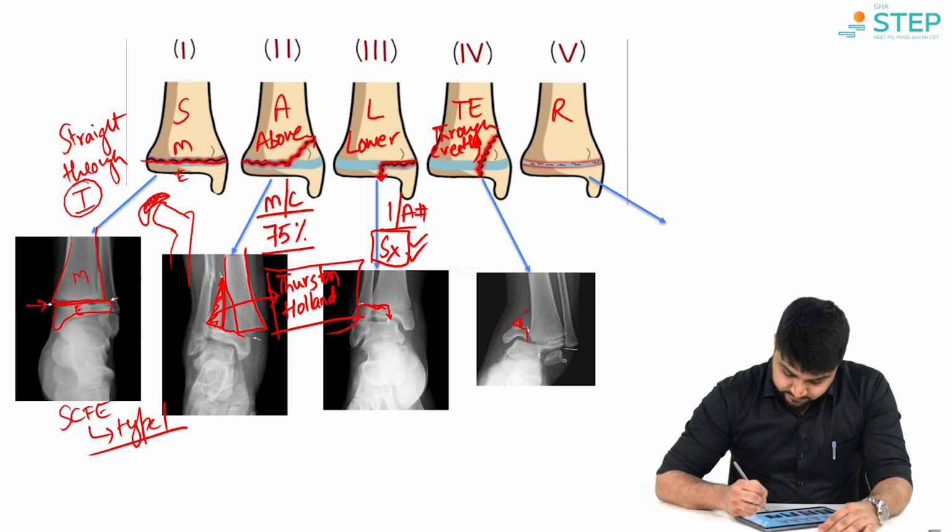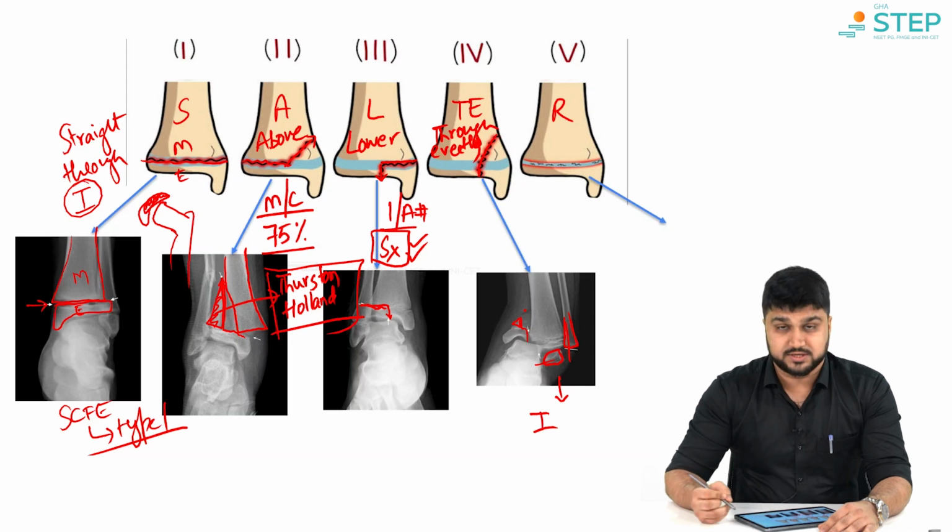You can see here in the fibula, the epiphysis looks intact, the metaphysis also looks intact. However, the relation between these two is definitely altered. So, the fibula here is an example of a type 1 Salter-Harris injury.